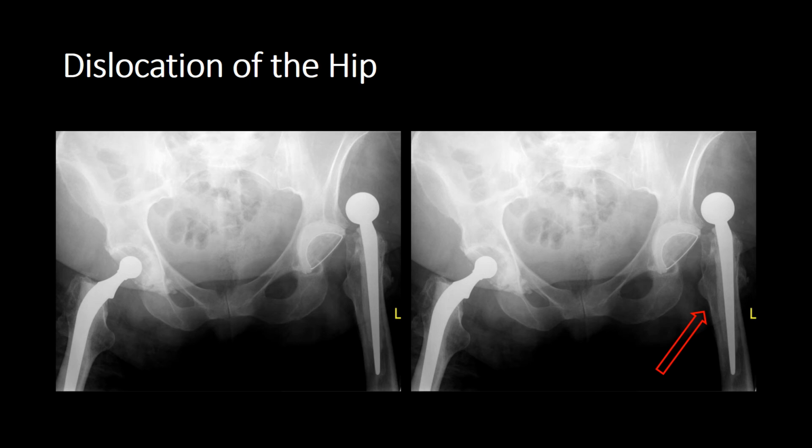There's only been a replacement of the femoral head and stem. People with total hip replacements, like this patient here, have had both the acetabulum replaced as well as the femoral components. So a total hip replacement is when the acetabulum and the femoral component are replaced, and a hemi is when only the femoral components are replaced.